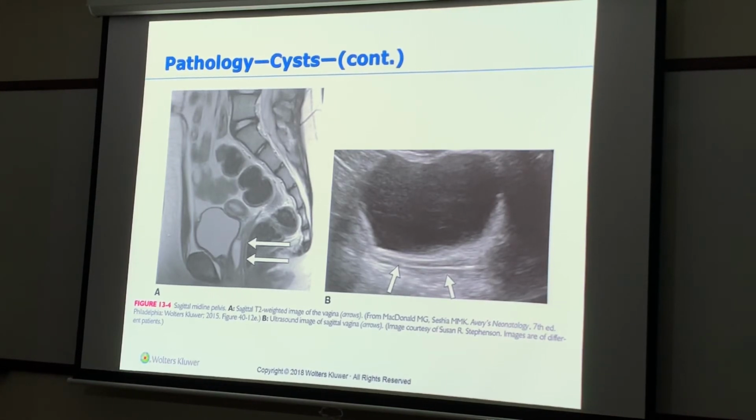What about the blood? Will we have a hematoma? Yes, I could, if it's menstrual blood. Hematometrocolpos. But if it's just anechoic, it's hydrocolpos.